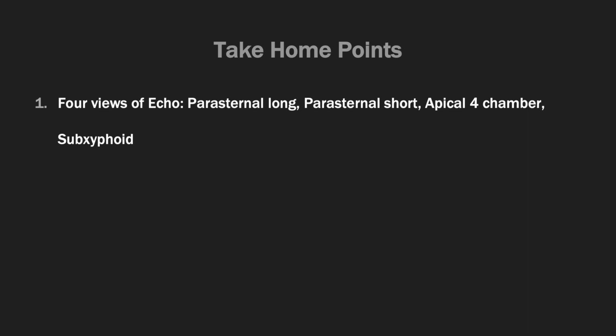So that may have seemed like a lot of information, but again, this is just an introductory video, and we hope that you take these few things away from the video. First, there are 4 views in echocardiography: parasternal long, parasternal short, apical four-chamber, and subxiphoid.